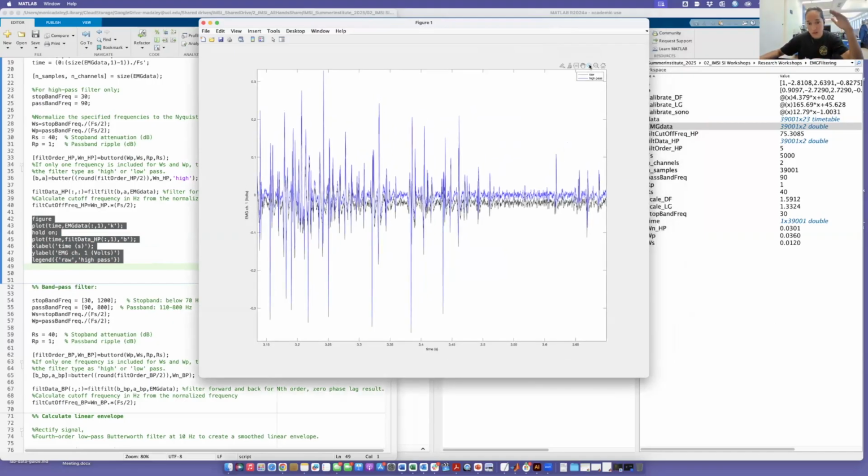Just looks like they're offset from each other. Yeah, so mainly the original raw in black had an offset so it wasn't centered around 0. It had a DC offset. If you apply a high pass filter, it always removes the DC offset. So that's important to note, right? Because that DC offset is basically a low frequency component of 0 hertz, right? That is getting removed.